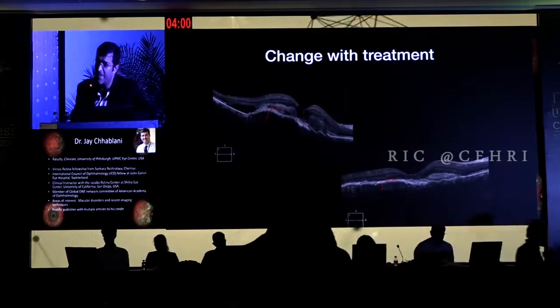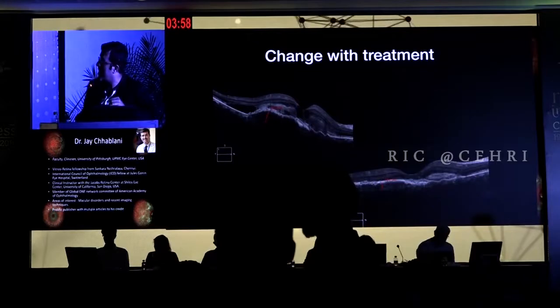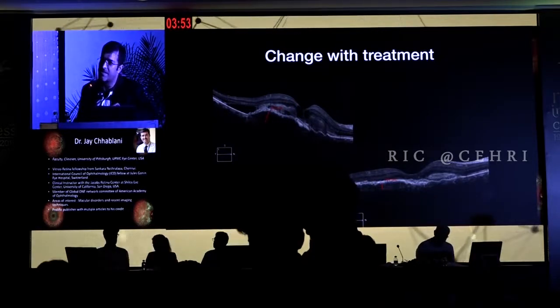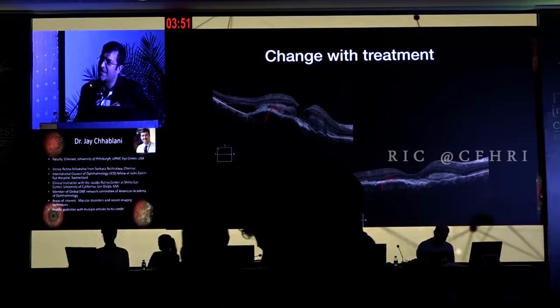It does change with the treatment. As you can see here, the SHRM has resolved almost completely at the subfoveal area, but just in the parafoveal area we can still see it.